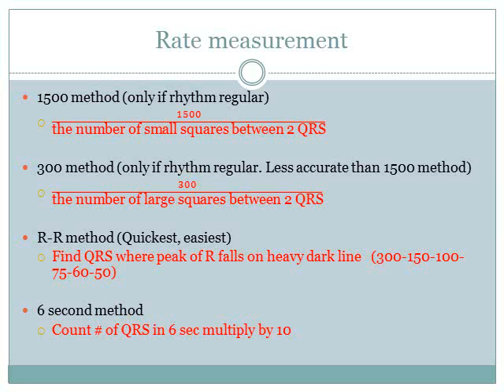What we do here is we select two QRS complexes and give these numbers for the next dark big box, the mark of the big box. It is easier when I show you, so it comes in the next slide. So I'll explain it to you when we are in the next slide.